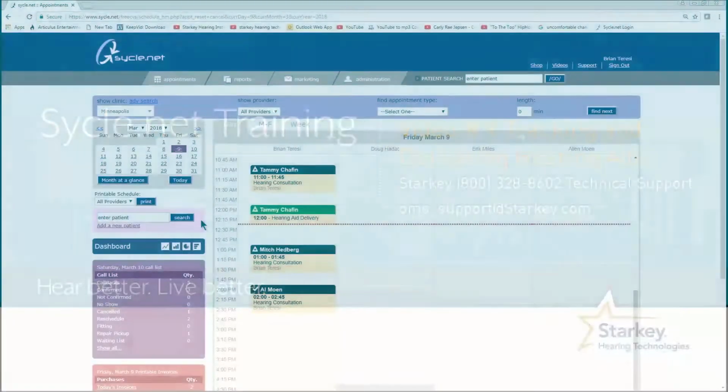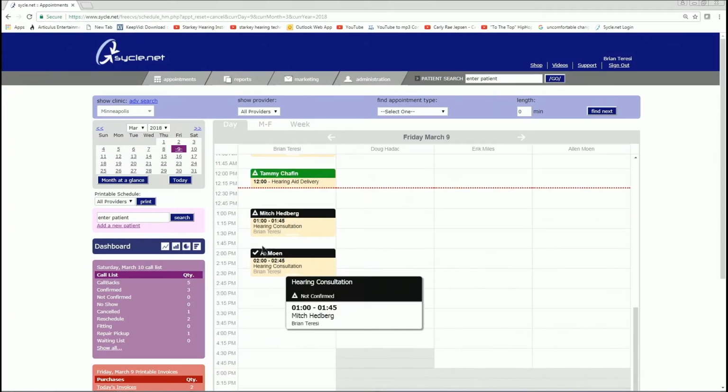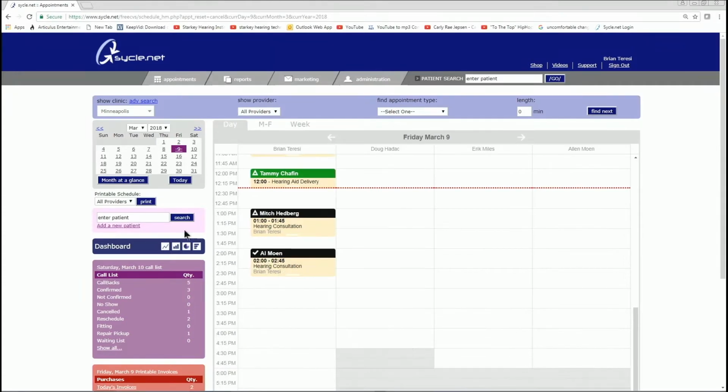In our last video, we talked about creating a hearing aid purchase. And today we're going to talk about how you track that purchase and how you deliver those hearing aids to the patient. In our last video for Al Moen, we created a hearing purchase for him. If I wanted to, I could go in and find that purchase, which I'm going to do really quickly.